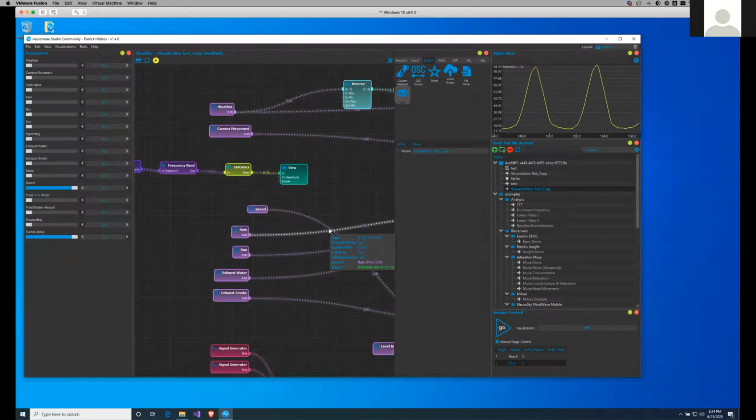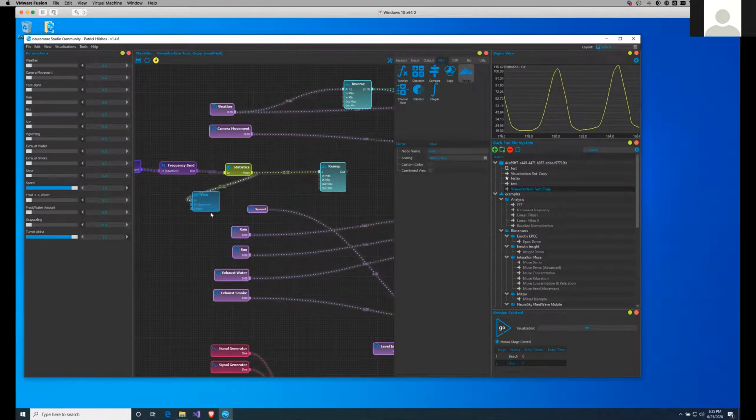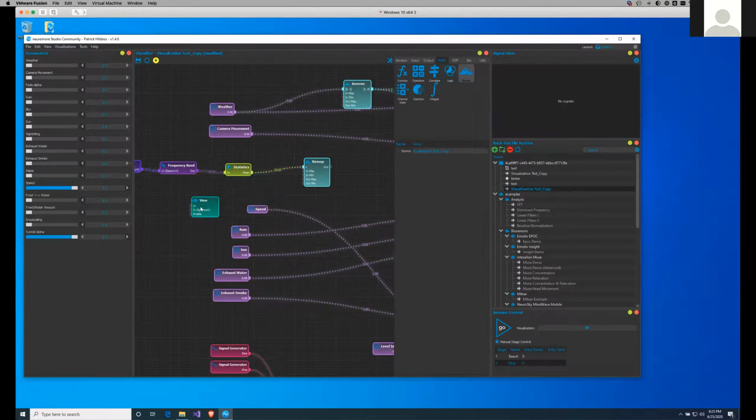And we already saw that the range of the parameters that need to go into the visualizations needs to be between 0 and 1. So how do we get that output remapped to the range between 0 and 1? The short answer, there's also a node for it. It's our remap node. It's also under the section mathematical nodes. So now we connect that as an input. Let's just replace it, remove that connection. Now we add the output of the remap.